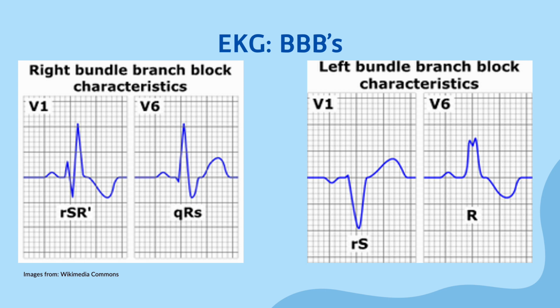In an EKG with a right bundle branch block, the QRS complex is usually wider than 0.12 seconds, and the terminal QRS deflection is usually in the same direction as that of a normal EKG. It is important to note that these are general rules and there are some exceptions. For clarification, an upward or widened deflection in V1 would indicate a right bundle branch block, while a downward deflection of a widened QRS would represent a left bundle branch block.